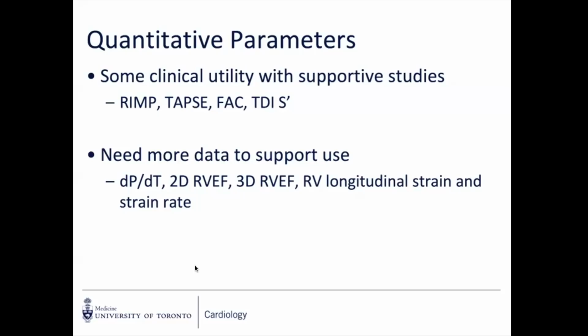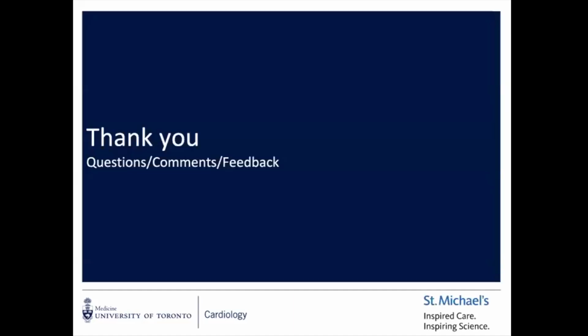The one wall area that I'm not sure we look at enough is in the setting of inferior infarction. So when the inferior basal wall of the LV is abnormal, make sure you look at the posterior wall of the RV, and that you see it in that short axis view, because I think it's often not normal and we ignore it. No, I agree with you actually.